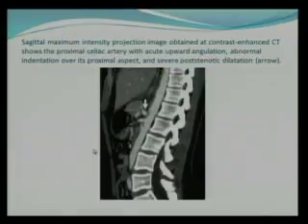Alright, so as I've explained to some of you, the way I remember it is that always in all abdominal angiograms, look at the sagittal image. You must look at the sagittal image where the celiac axis and the superior mesenteric artery are coming off. This is a very classic hook-like impression. That's how I want all of you to remember it.